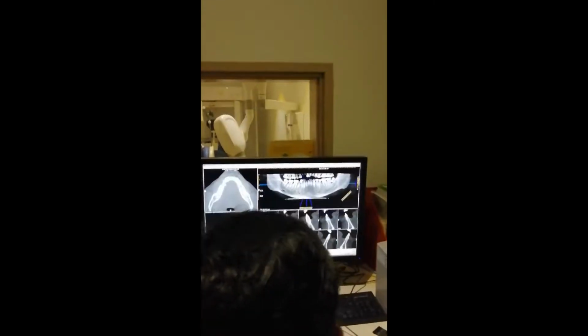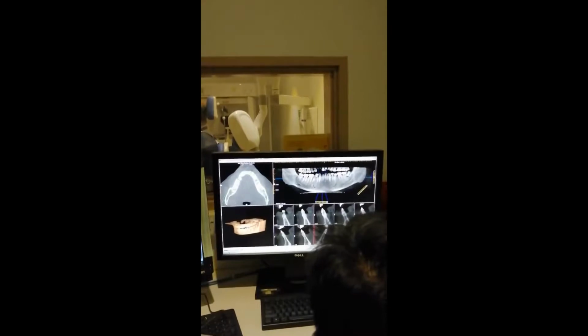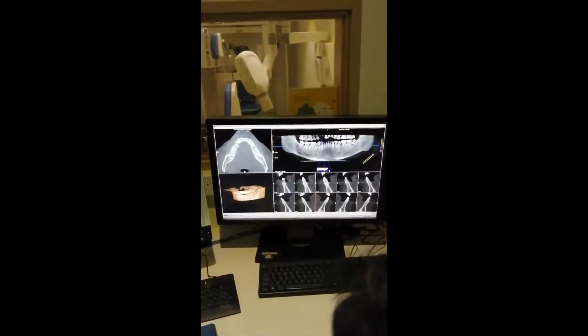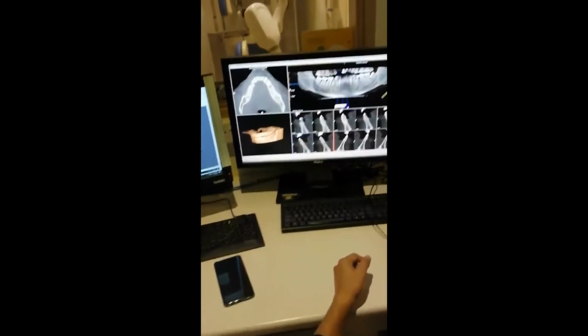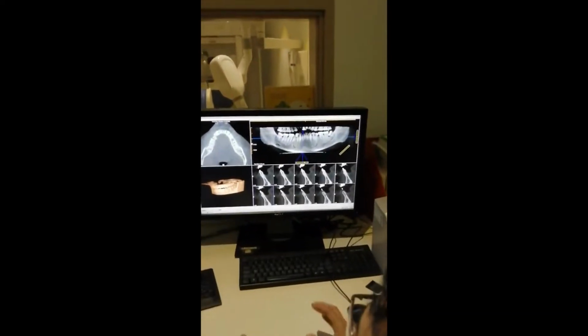Okay. So I have some lines here now. Now I have a button here. I click it and it is showing 2 millimeter thickness. I have to reduce the thickness, to 0.25. So what is the meaning of the 2 millimeter thickness?